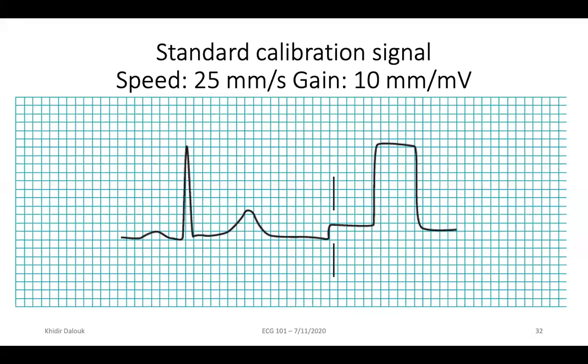the ECG is basically, as I mentioned earlier, a voltage recording graph per unit time. So you can see that the ECG travels at a speed of 25 millimeters per second, and it's calibrated in a way that each unit of amplitude is equivalent to 10 millimeters of distance.